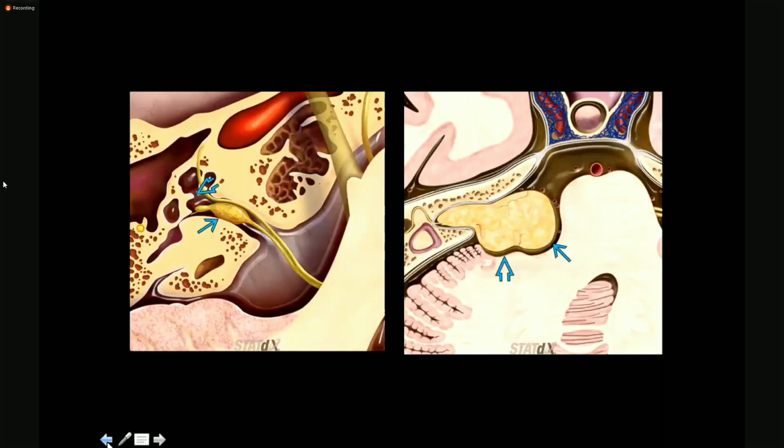For example, they are showing you a T1 weighted axial, and they show you a lipoma, and you don't know that this is T1, and that on T1 hyperintense is blood or fat. So how will you make your diagnosis? So it is very important to recognize sequences. It is very easy, especially in brain. You have to look at 3 things, gray matter, white matter and CSF. And on the basis of that, you will decide whether this is T1, T2 or FLAIR. And in diffusion ADC, you can't see the anatomical details, so you get to know that this is diffusion. They must have made the ADC with it, so they will be showing both together in the set.